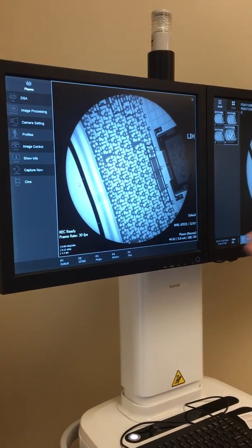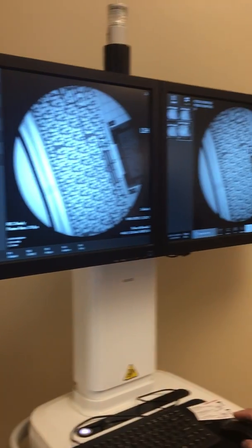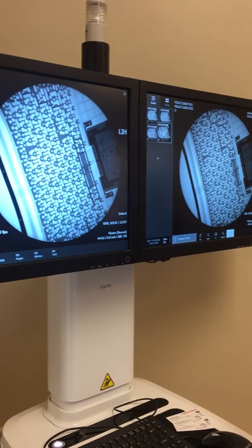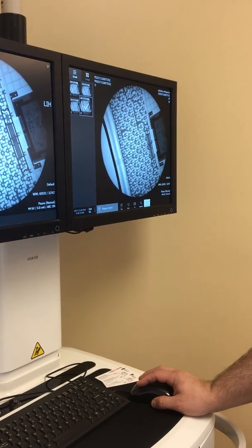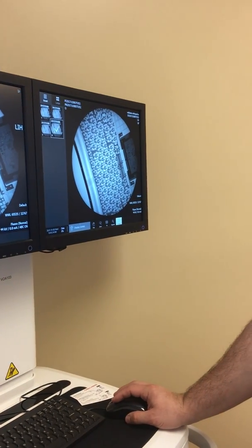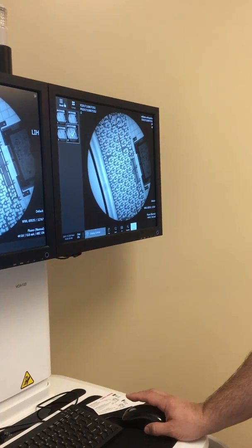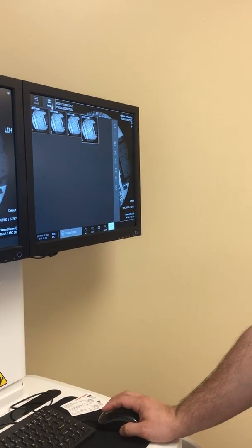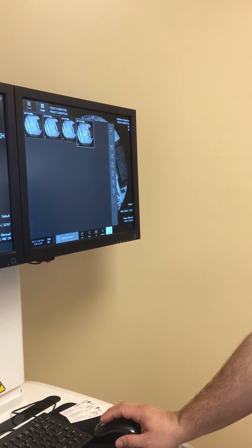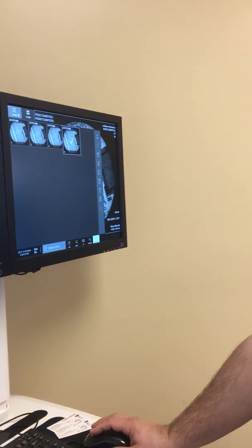Screen in a study. All right, now we move over here. So on the left here, these are all your required images. Okay, now we're in small, so it's just showing you a thumbnail. If you hit large, it's going to throw thumbnails.